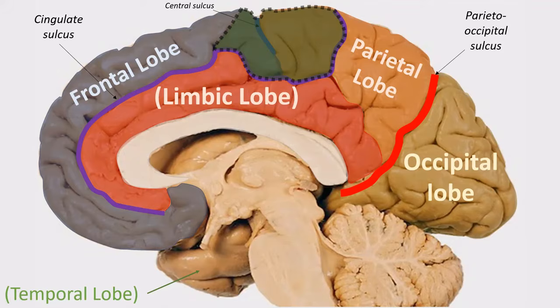Because we are watching the medial extension of the precentral gyrus situated anteriorly and the postcentral gyrus situated posteriorly, which are not anatomically completely divided from one another on the medial surface and basically form one unit or one structure called the paracentral lobule.